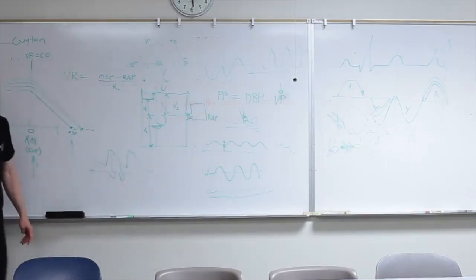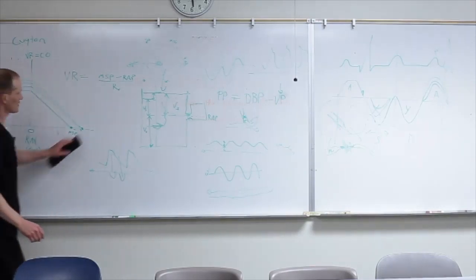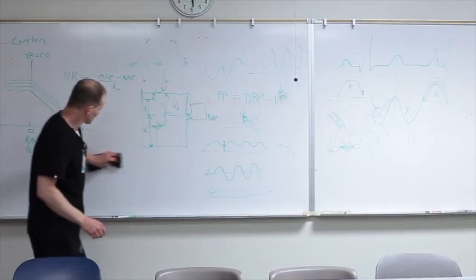Okay, so problems with the IVC measurement. By and large, I don't see it too often, but everyone needs to be aware of it.